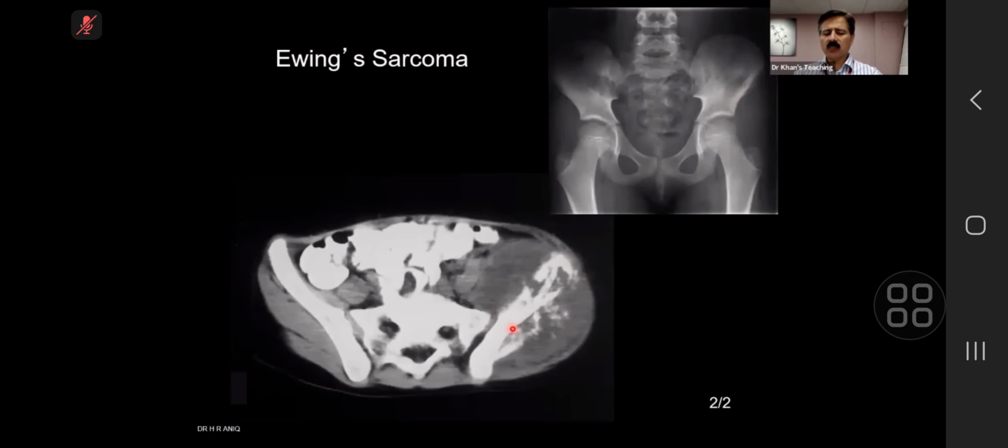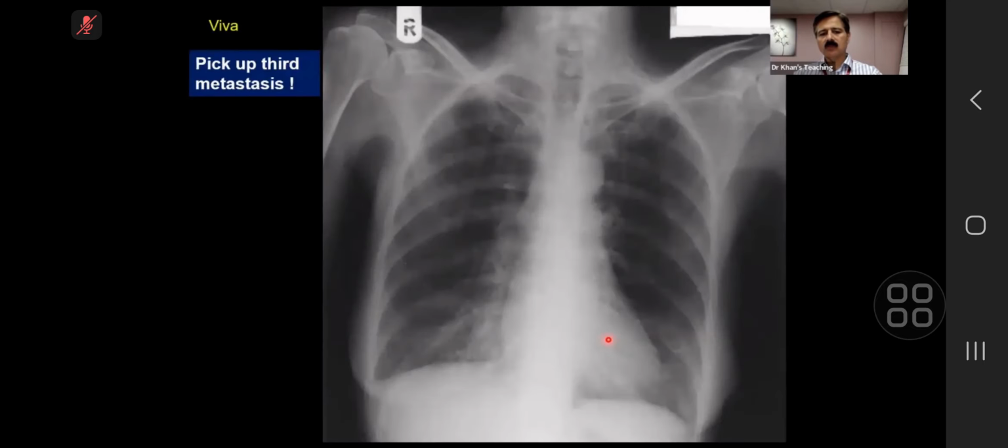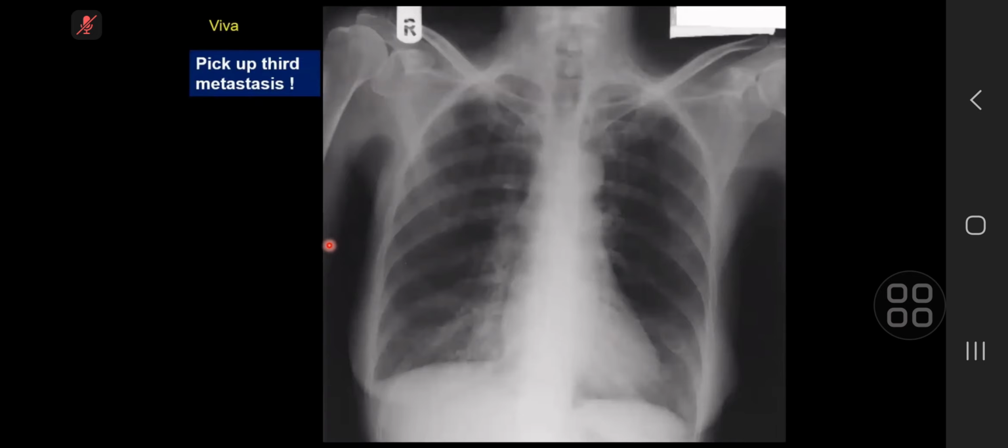Having said that, it's fine. In the exam, it's fine. You've done your duty once you pick it up and ask for an MR, not a CT. But even on this CT, you can see this soft tissue, how thick it is. Actually, this is not the last case.